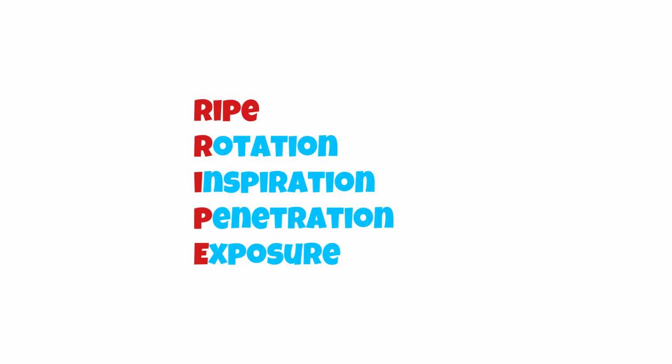In summary, in order to interpret the chest X-ray, it's important to clarify the demographic details of your patient, to comment on the quality of the film using the algorithm RIPE: rotation, inspiration, penetration and exposure, followed by a top-to-bottom approach in interpreting the X-ray.